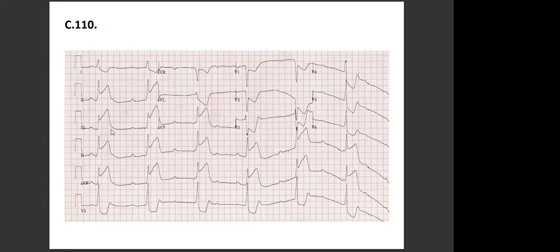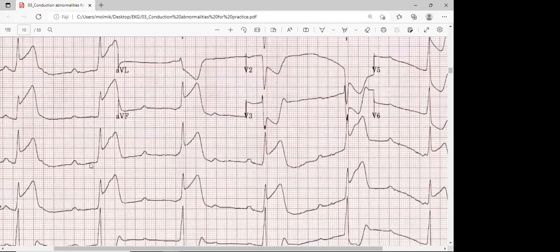We do have P waves, all right. However, look at the PR interval. Well, it's not the same. If we are lucky, look at that one. We have 2 Ps. So we know that the rate of the Ps is around 75. So possibly we do have some other hidden P inside the QRS complex. We can hunt for it, and sometimes we can see it when we magnify. That would be nice.